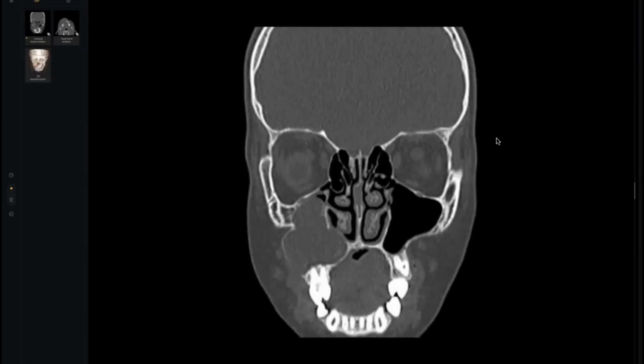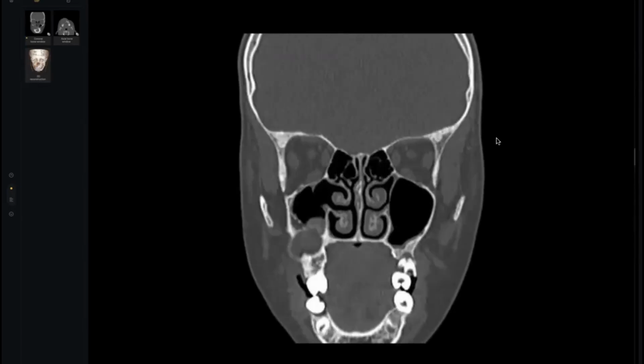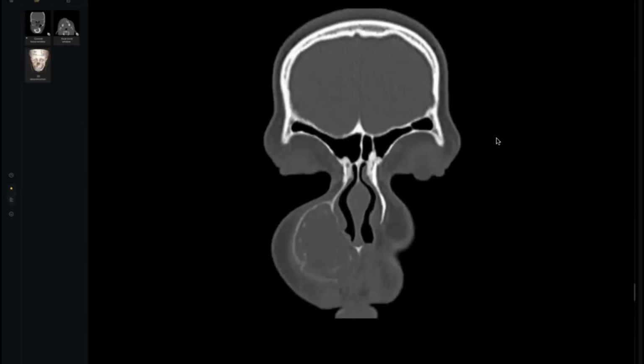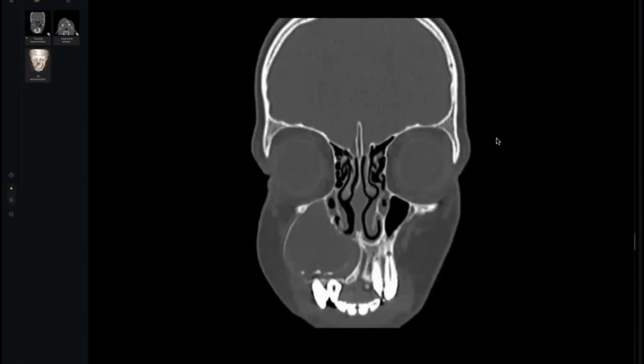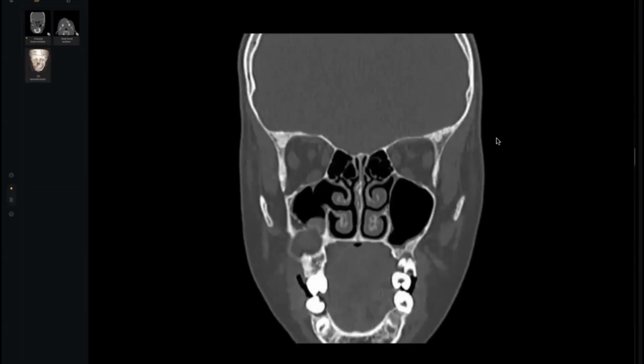And how to differentiate it from the dentigerous cyst? In the dentigerous cyst there will usually be an unerupted tooth related to it. It is not looking like an erupted tooth here. How do you differentiate it from adamantinoma? Adamantinoma is usually multiloculated, a locally aggressive tumor with sometimes a soft tissue component also. So it is less likely here.